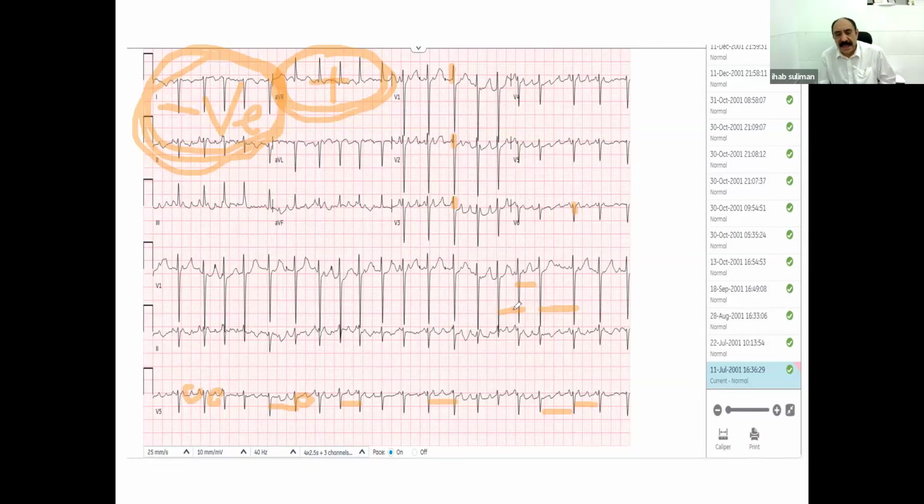So this patient had atrial flutter, and she also has a dual lead pacemaker, and she has dextrocardia. Dextrocardia is rare, 1 in 15,000. It could be associated with situs inversus, Kartagener syndrome, bronchiectasis, and other issues. So let us move on.